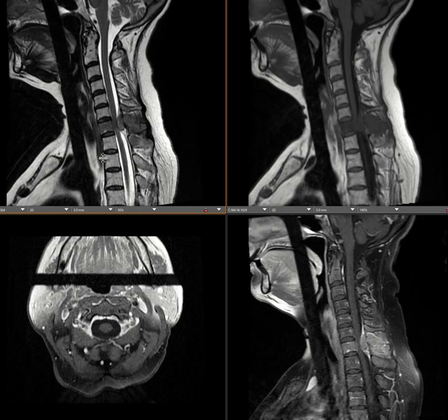we see that this sequence on the left is a sagittal T2 through the cervical spine. The image on the right is just T1, and the way I know is because all the CSF is dark, and then we see the bone marrow is bright, and also we see the fat is bright. So that's how we know this is a T1 sequence.